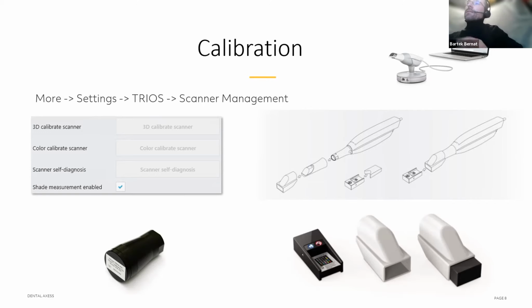It has two sides, side A and side B. Side A is to get the actual color, and side B is for some gray light distribution. It's quite technical, so I'm not going to cover more about that. Just a tip: your scanning tips can get a bit dirty with time, and the side B test is a very good test for those tips, because you do this calibration through the actual tip that you're going to use for scanning.